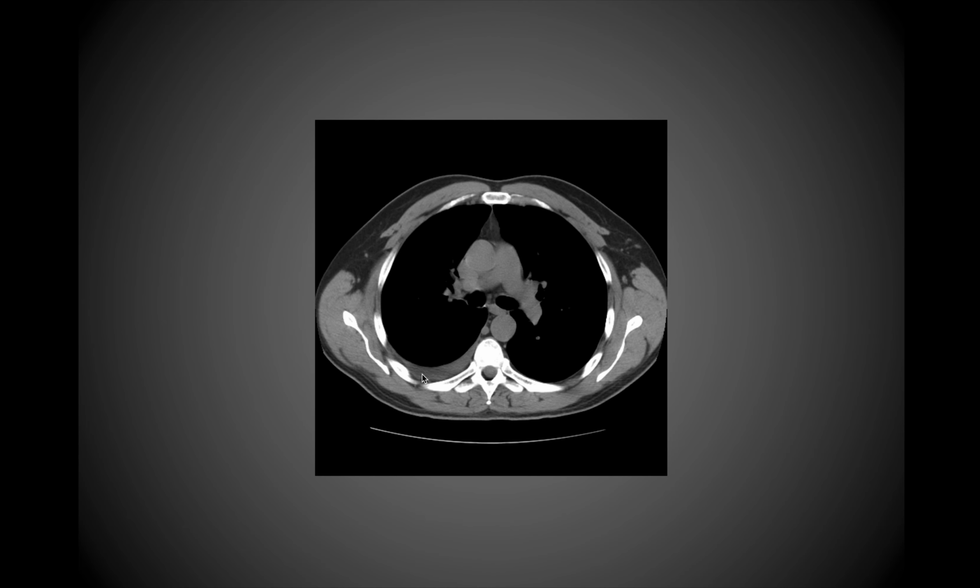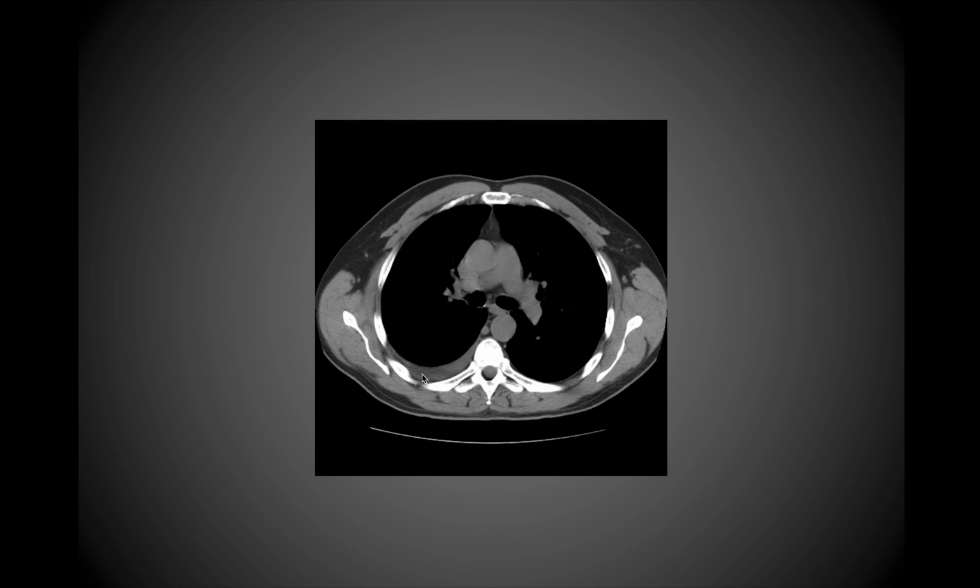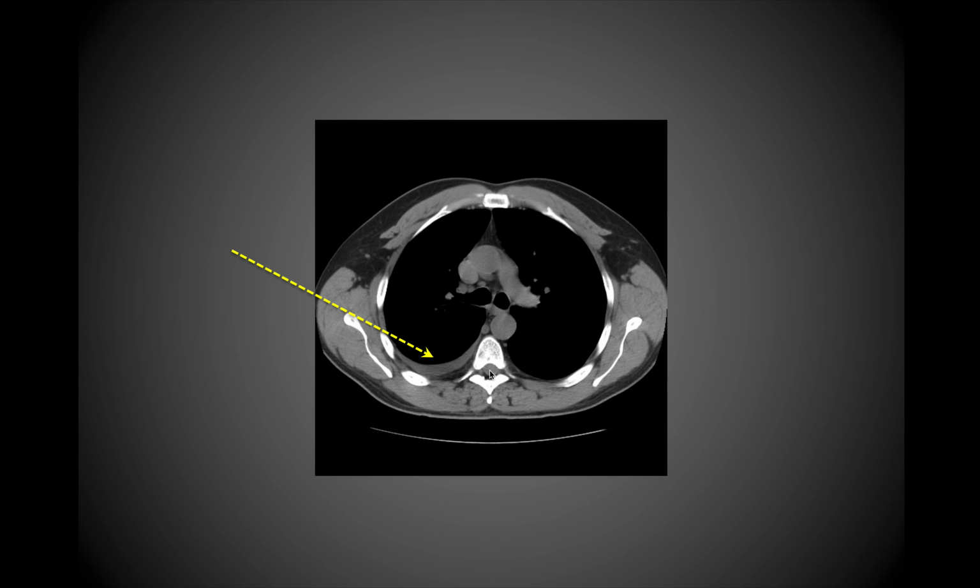And again, this is just going through a couple different views of this pleural effusion, and so this is a good chance to practice some of the anatomy that we've talked about here. So make sure you can identify the right and left pulmonary main stem bronchi, the descending aorta, the azygous vein, the ascending aorta, etc.